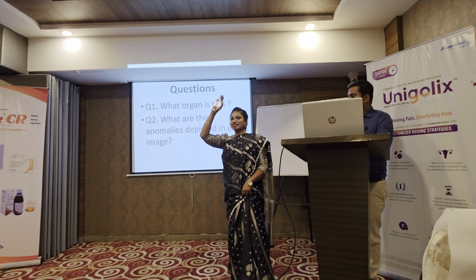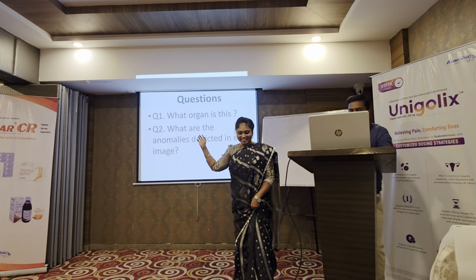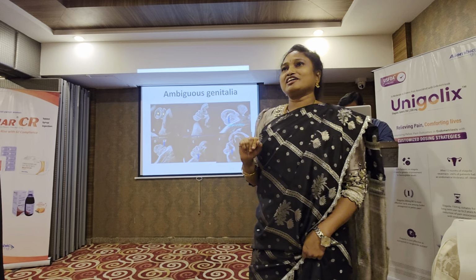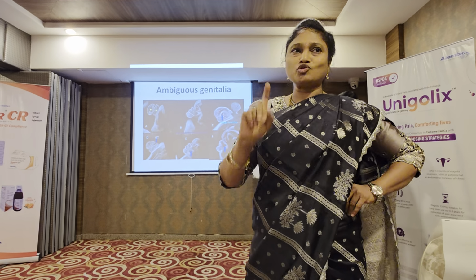No, you are right on top. We are somewhere down below. Next one. This is ambiguous genitalia. That's what we keep saying. We should not look at the genitalia because of PCPNDT. We are supposed to look at the genitalia.